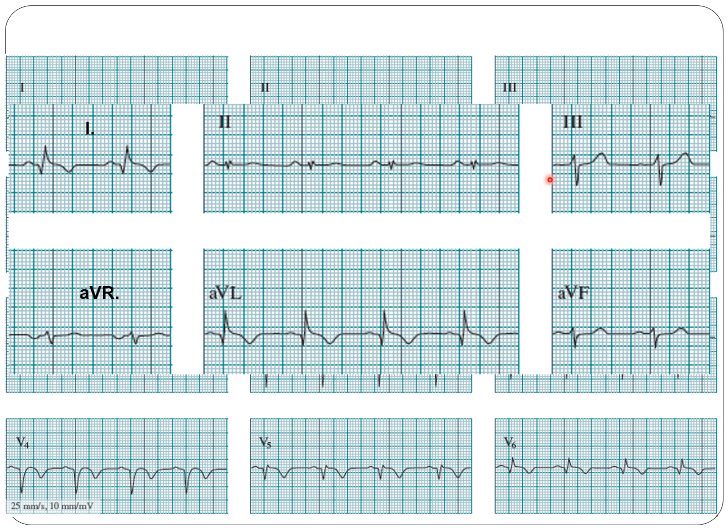Axis: leads 1, 2, 3. 2 is the smallest one, 3 is negative, 1 is positive, AVL is positive, so that is close to... AVF is negative, so it's close to minus 30.